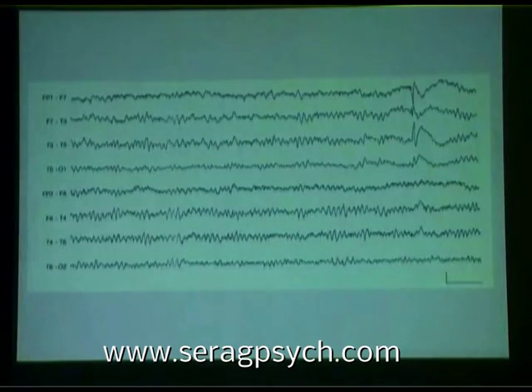Next, please. Now, I told you a few slides back that there's more to temporal lobe epilepsy EEG than spikes. So this is the right temporal, and this is the left temporal. If you look carefully, I know there's some perturbation here, some slow waves for some reason or other, but this is basically normal EEG there on the right side. But notice the slow waves on the left. You see those? Forget this for now. Just look at the slow waves.